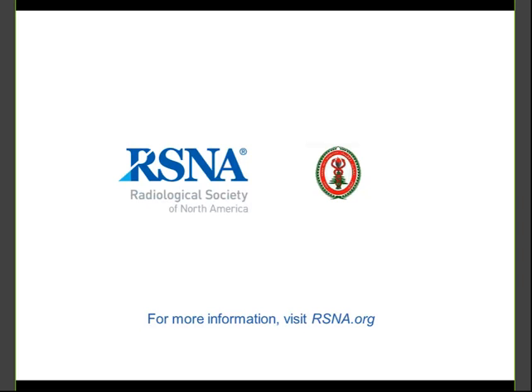Yes. I will say that something is pseudomyxoma peritonei when I see rupture, meaning I see implants and ascites that has mass effect, like the classic scalloping along the liver or the spleen and the upper abdomen. And I'll be looking for peritoneal and omental implants, carcinomatosis. And with ascites, then I think that there's pseudomyxoma peritonei. But it usually has that scalloping, loculation, mass effect on the bowel or organs, liver and spleen that you don't see typically with just simple ascites.